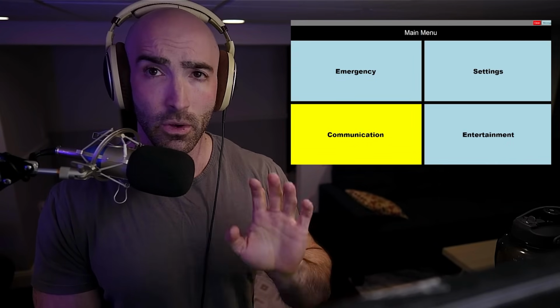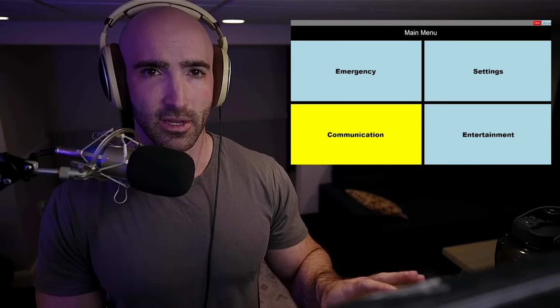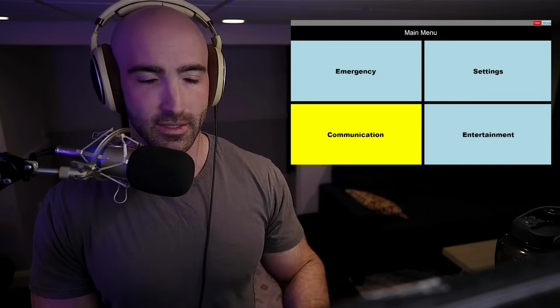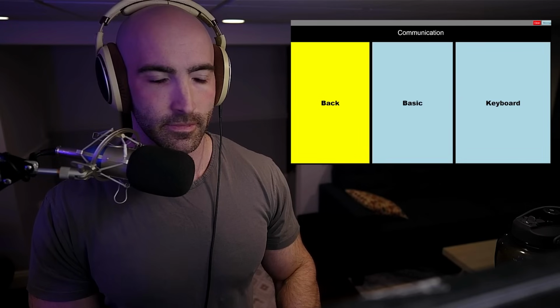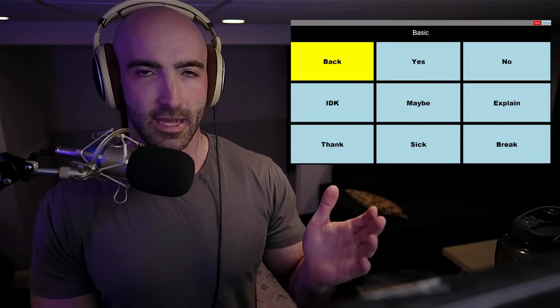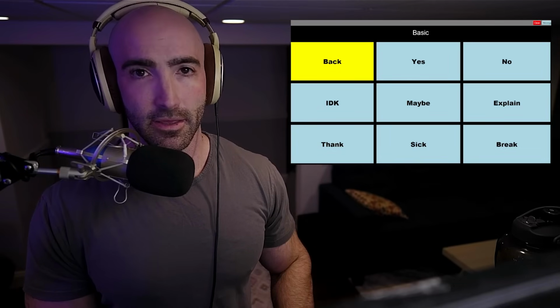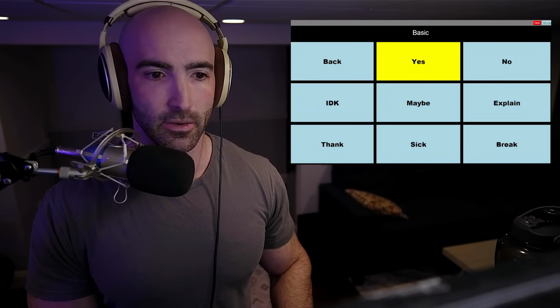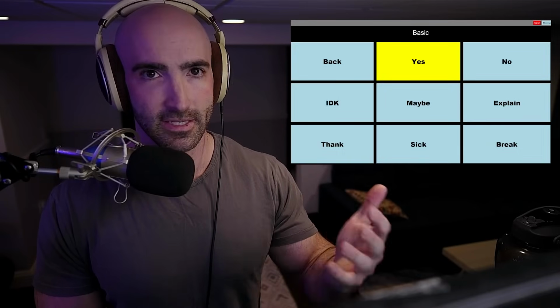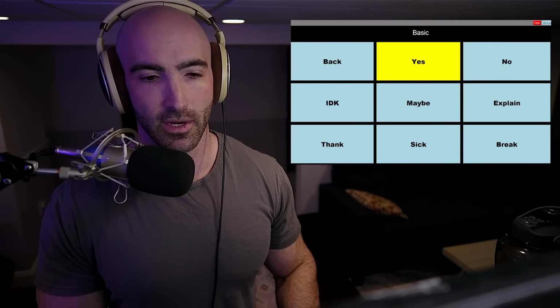So I'm not going to go into all the settings here, but I'll go into the new features. So communication. We'll go into communication first. Also, you'll hear that everything is text-to-speech on this. That's because Ben's vision isn't great, and we want to make sure he hears exactly what he's clicking on. Communication menu. So in the basic menu, Ben has standard stuff: yes, no, I don't know, maybe, explain, thank you, I feel sick, and I need a break. So just quickly he can get to it and say something to us. That way he doesn't have to type something out. This is like his quick phrases if he's just sitting and using his computer and he needs something.